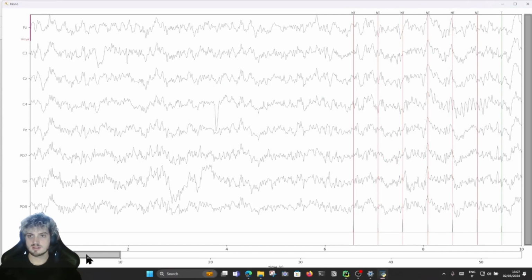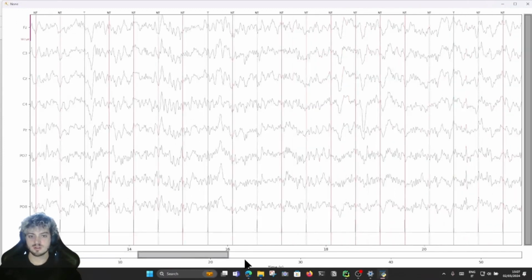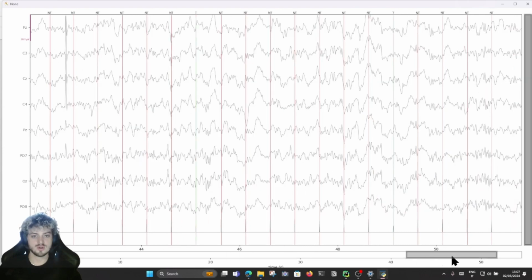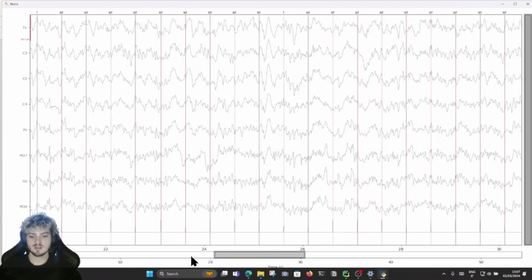Since this is an interactive plot, you can actually go through all the data. It's 1 minute of recording. You see the red strips are the non-target events, and the green ones are the target events. This is very handy, and you cannot do it with a static plot.